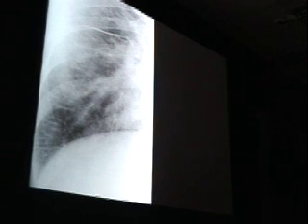Now, clearly the hallmark of interstitial lung disease is the demonstration of septal lines, or as shown here, what are often referred to as Kerley's B lines. These lines at the lung base that hopefully you're all familiar with, basically about 1 centimeter long, extending out to the pleura and stacked one over the other. If you see lines like this, you know you're dealing with interstitial lung disease.